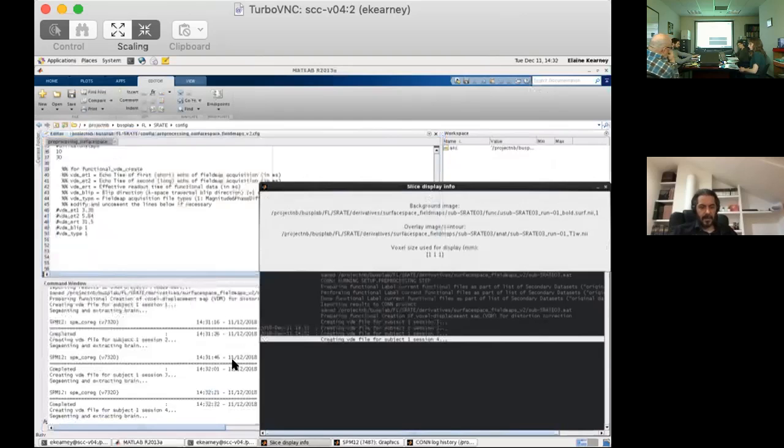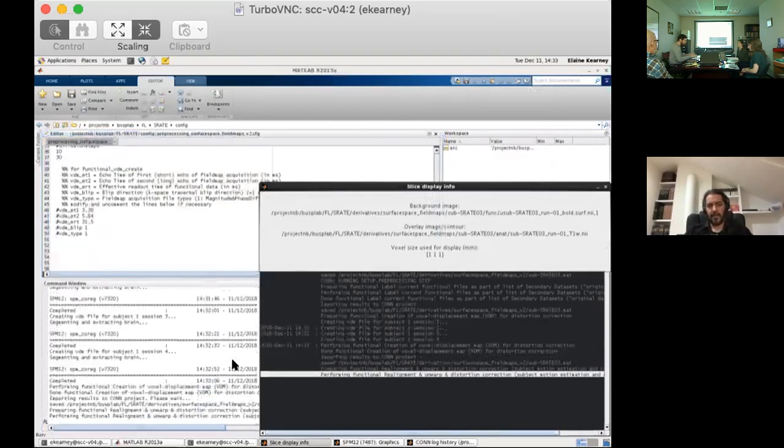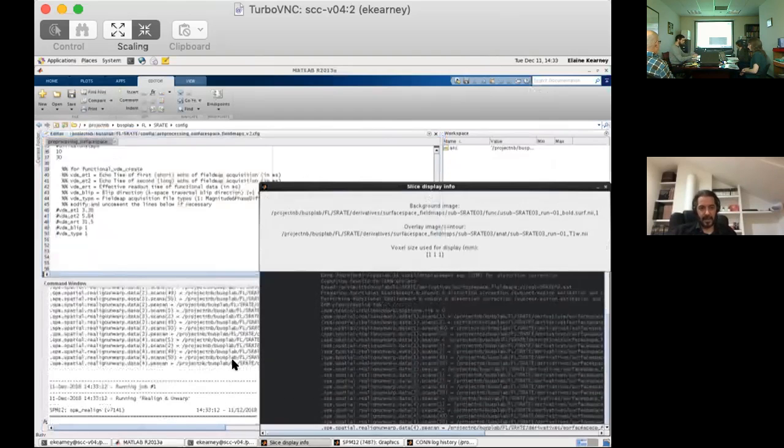And then that sort of bore out, suggesting it wasn't just a wrong image. With these field maps, they always tell you to look at the data and figure out whether it actually looks better or worse, and if it's looking worse, then try the opposite directionality, because that might be the typical case. And the problem with the directionality thing is that it's very confusing.